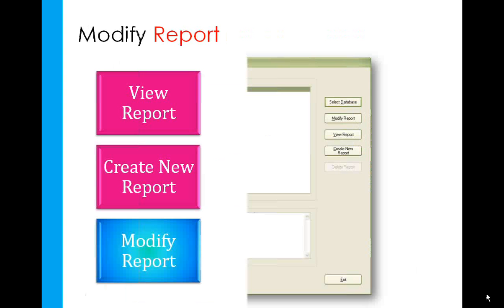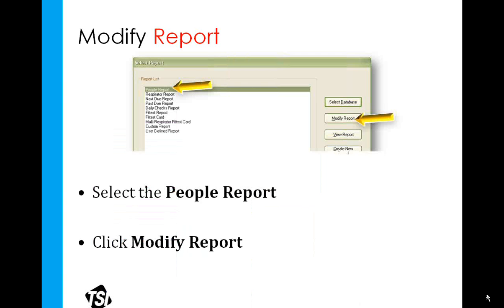Now we'll wrap up with modifying reports. And this can be done to the FitPro default report as well as with user-defined reports. Makes no difference. We can modify all of them. So we select the people record for report for now, and then we click on Modify Report.